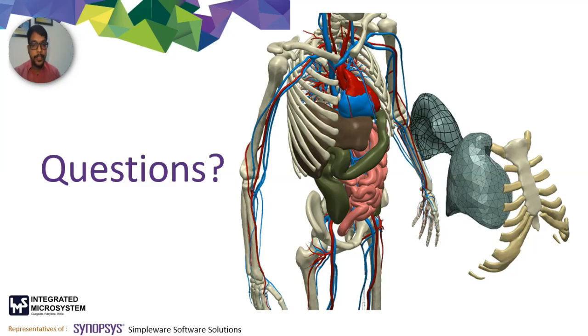After that, we have AS Ortho, which also includes your pelvic region segmentation. So pelvic region segmentation can also be done completely automatically. Sometimes that can prove a very tough task to do in a short amount of time. Just to give you a benchmark idea, an expert user takes around 30 to 40 minutes for the segmentation of the pelvic region accurately, with the smoothings and applying all the filters.